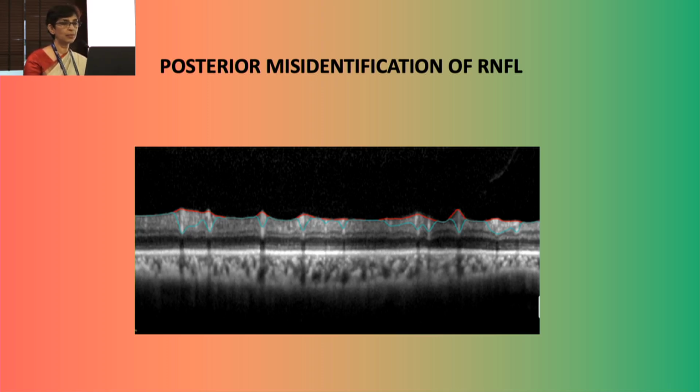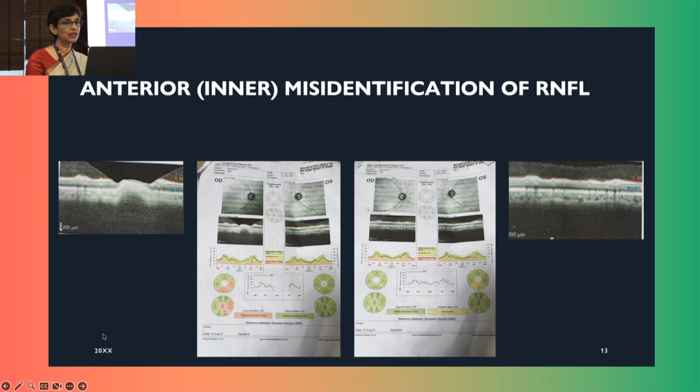That would always be measured. There would be nothing which touches the floor, like in this picture. You can see that the patient's OCT is touching the x-axis, and therefore it is giving something in the red here in the sectoral and the clock-hour maps. When this was corrected, it gave rise to a normal OCT pattern, as shown in this printout.